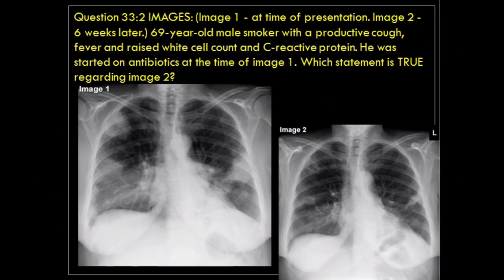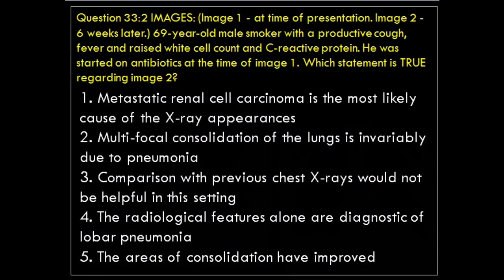Question 33: Two images. Image 1, at time of presentation. Image 2, 6 weeks later. 69-year-old male smoker with a productive cough, fever and raised white cell count and C-reactive protein. He was started on antibiotics at the time of image 1. Which statement is true regarding image 2?